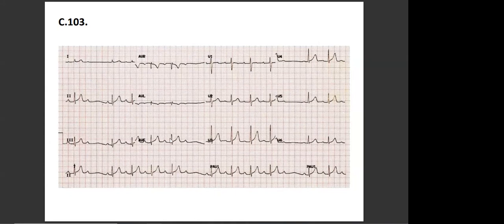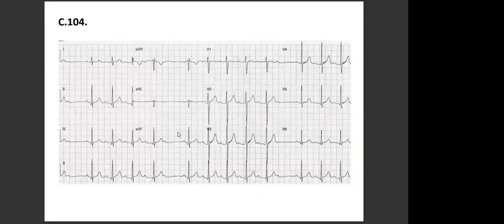Okay, 104. Yeah, that's me. Good. So the first 3 intervals are pretty equal, but then there's a dropped QRS complex. So I'd say it's pretty rhythmic. It's not rhythmic. Oh no, yeah, because we have a missing QRS complex. Okay, here you cannot say that. So no, that's arrhythmic, fine.